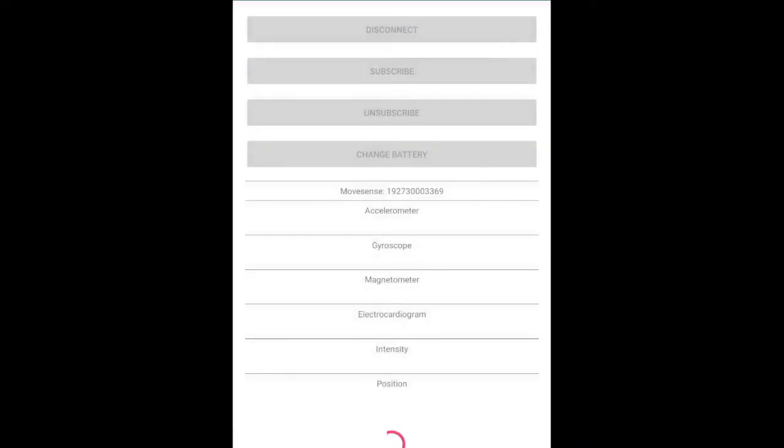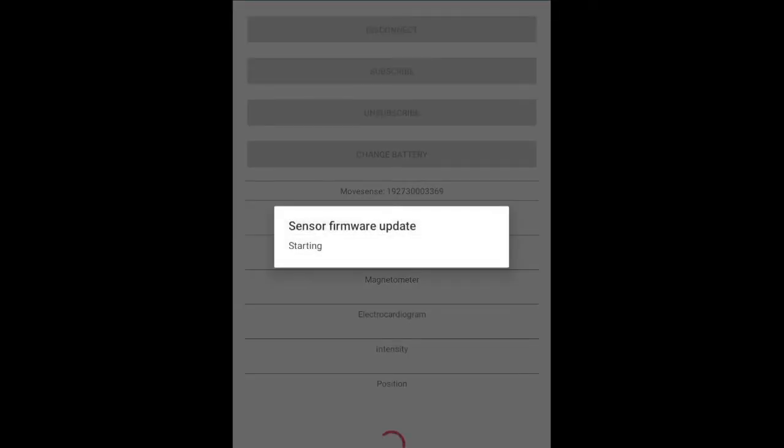With okay, we get the firmware version from the sensor and start the automatic firmware update, and here you see it's running in real time. After the whole firmware update has been done, the system is running as before. This actually saves you a lot of time. You can see that you have the sensors, like a full bucket of them. You don't even know what firmware is running on them. You just want to have a sensor and make the recordings.